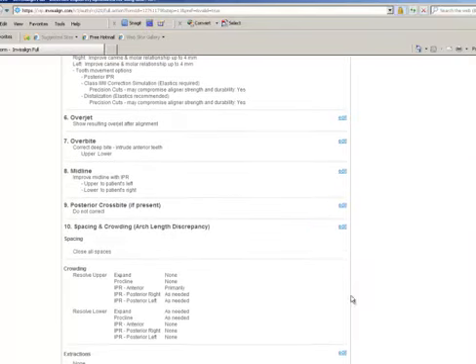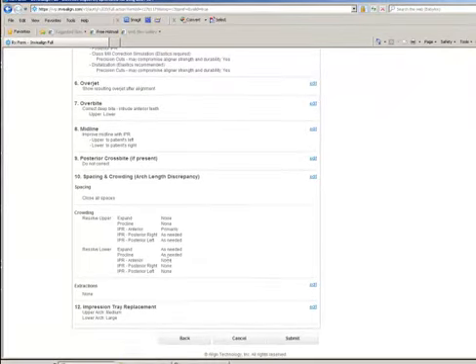And at the end, as you can see, every single mark I've put into the prescription is there. No extraction, medium, large. And then when you're ready, you can submit. Obviously, this one will not go because it's just a demo, but you submit on this blue button here, and Invisalign immediately will ask you to print. Just submit, print, and then you're ready to send your impressions and bite registration to Invisalign with our secretary. Thank you.